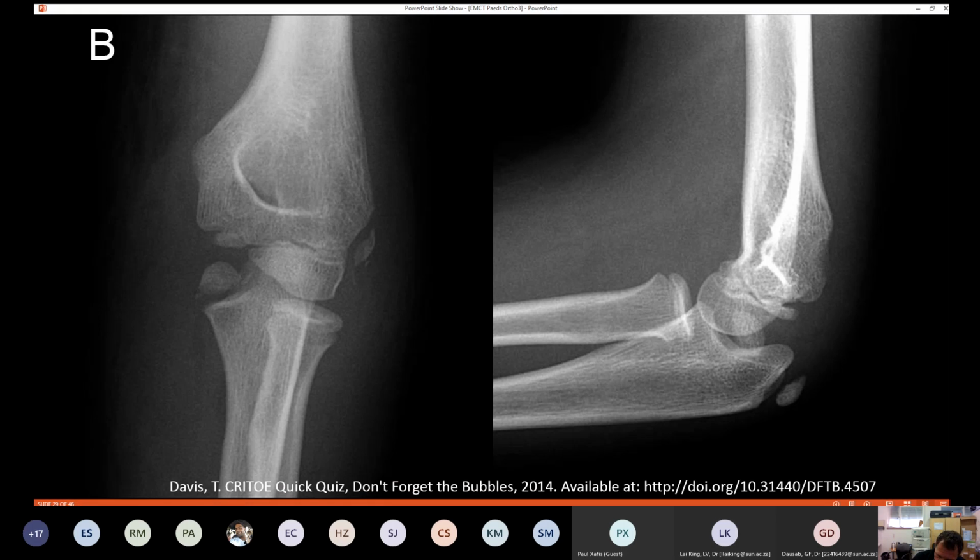So getting back to the X-ray we had our poll on, 68% of respondents said that this is a supracondylar fracture, okay, which I understand, because if you draw that line, it's probably still in the middle third of the capitellum, but it might be anteriorly displaced. So I agree that is one potential injury, but there's no obvious soft tissue swelling here. Neither is there any soft tissue swelling here.